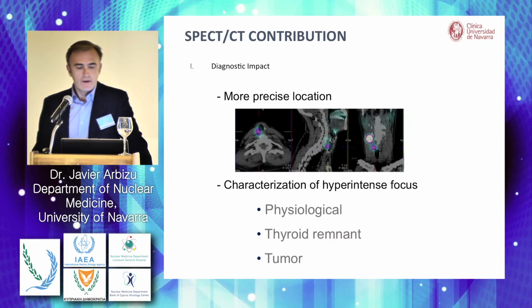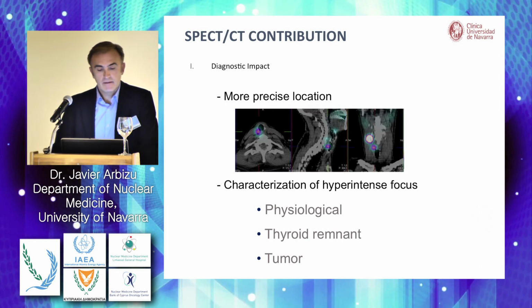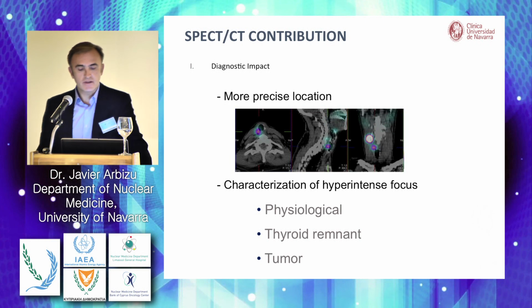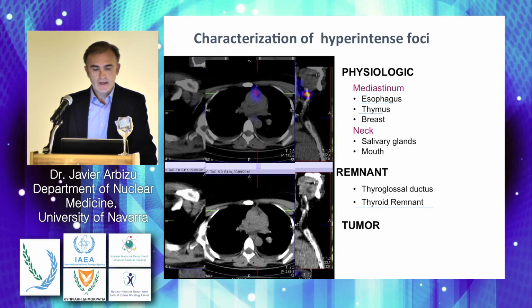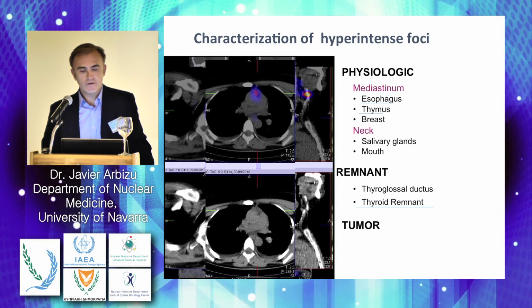Well, the diagnostic impact is the more precise location of these high uptake hotspots that you can see in the whole body scan, and the characterization of these hyperintense foci as physiological, remnant, or tumor. Look at these different images from different SPECT-CTs.